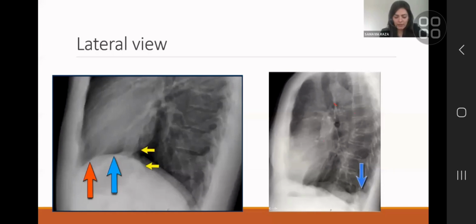The most important thing on a chest X-ray, approaching lateral or frontal view, is: I see something. Can I explain it away? What I mean is, when I see something, can it be something that is normal? So the minute a registrar says, oh, that's a nodule, I say, what else can it be? Can it be something in front of the lung, behind the lung, next to the lung? Try to explain it away. And when you can't explain it any other way is when you come to the conclusion that this is pathological.